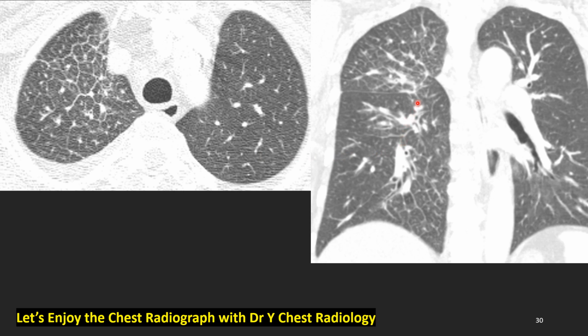How about the coronal image? Yes, we see nodules, prominent core, septal thickening. The left side bronchus wall is not thick, uniform in size, but the right side is thick, irregular. Recognizable. Yes, this is bronchovascular bundle thickening, septal thickening. Yes, all represents lymphangitic metastasis.